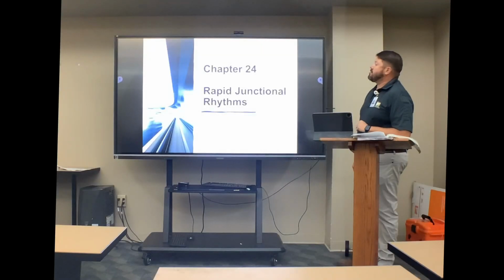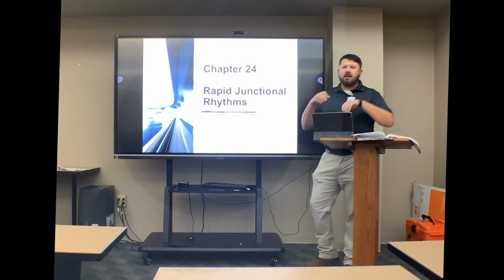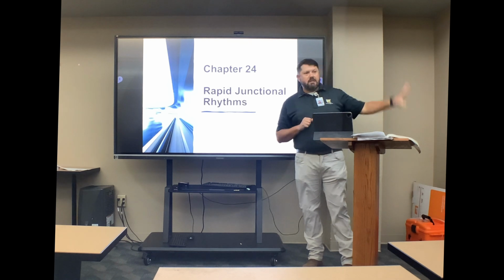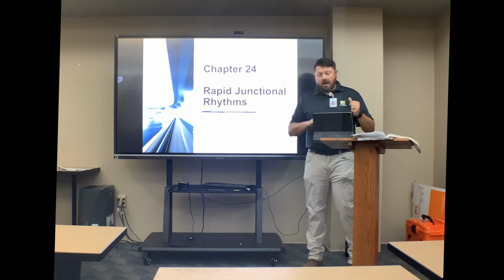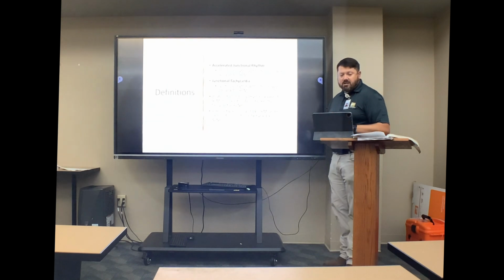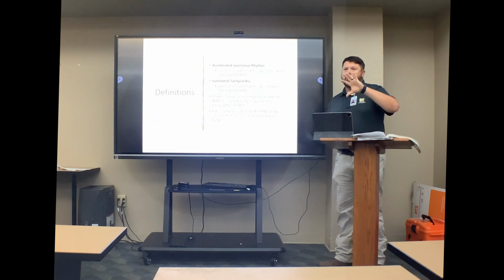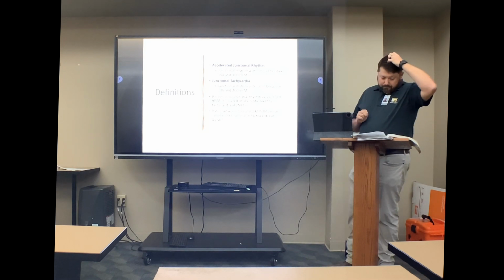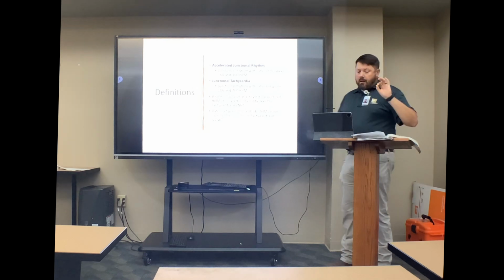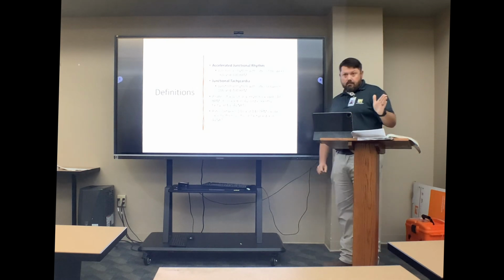All right, rapid junctional. So we're going to talk about rhythms that follow a lot of the same rules that we just looked at. They're just, what do you think? Rapid. Now, I am going to briefly mention here the pseudo S wave and the pseudo R wave, which will make a little bit more light on what we just saw with those post QRS P waves. But with our rapid, you're going to have accelerated junctional rhythm.